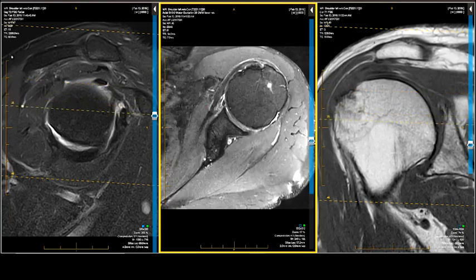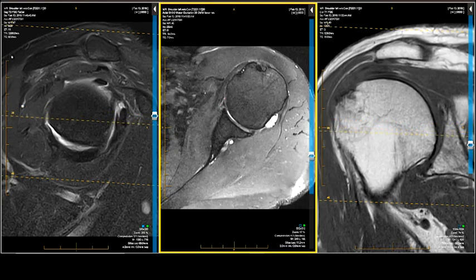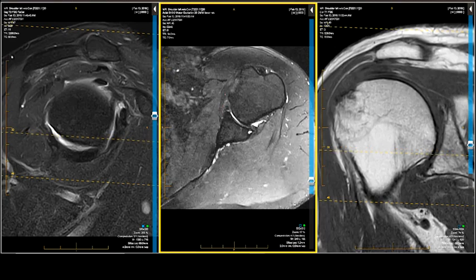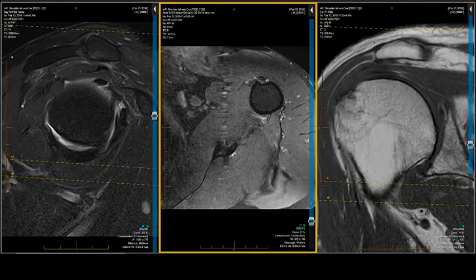Here's the MGHL, which is very linear. It sits right underneath the subscapularis. And then when it becomes more arcuate, it's still straight, still MGHL, MGHL, and now it makes this arc-like turn and gets a little fatter. Now it's IGHL, anterior band. There's also going to be an axillary band and a posterior band.